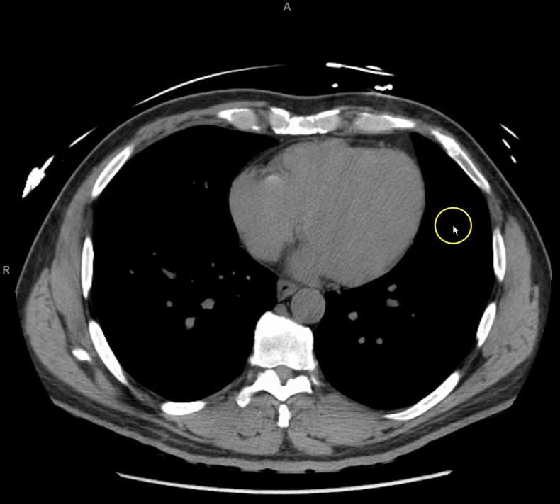What you see is really dark spots that are black have the lowest density. So here, what would this really dark spot be? Which lung? And this is the right lung. Things that are super bright and white have the highest density. So what would this be? Vertebral body, right? And these other ones, ribs. Each one is a separate rib because your ribs aren't exactly horizontal. They're oblique, so they come in and out of each image.